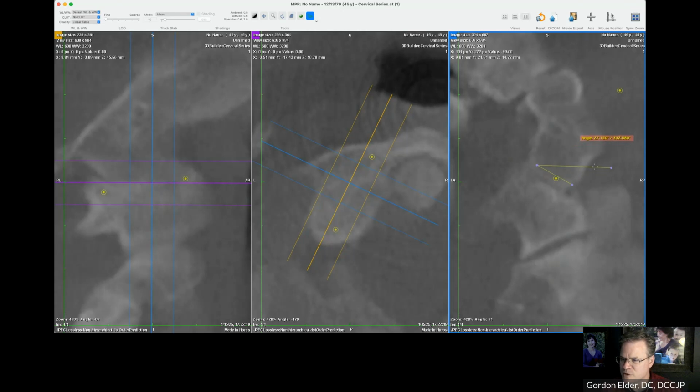So I'm measuring the occiput. I'm going to move it off the joint a little bit, so when I take a screenshot, it's not on top of there. It's just my particular process. Let's bring back the lines, and we'll see that my guesstimate of level wasn't quite true. There we go. So this guy's got a 28.4 degree left slope angle. For a Blair doctor, that's important. We'll use that to set up when we're trying to correct the joint if we need it.